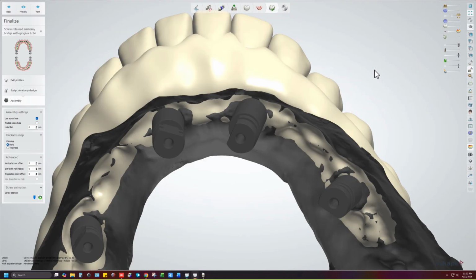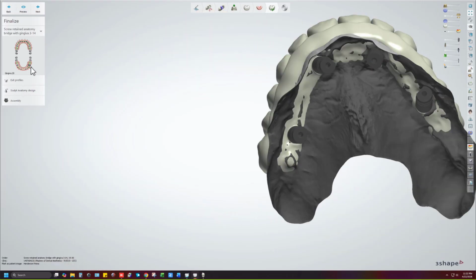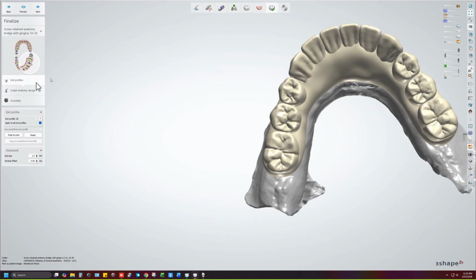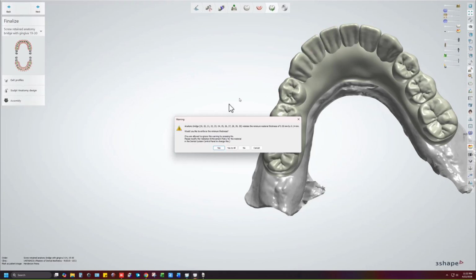And then when we do the lower, that'll process the lower, it'll work. Now, for the iCAM, there are 2 scan bodies. There are the iCAM scan bodies, which are the most accurate for scanning, and then the IO scan bodies.